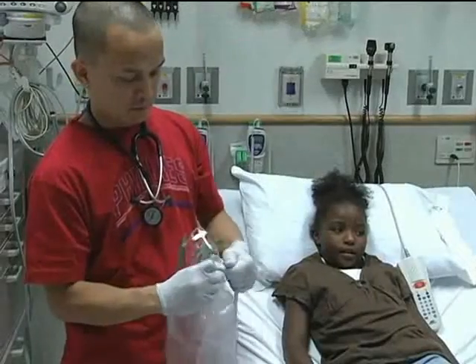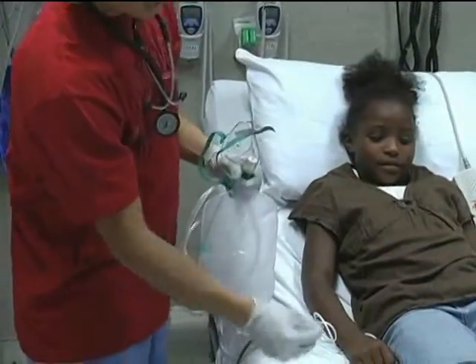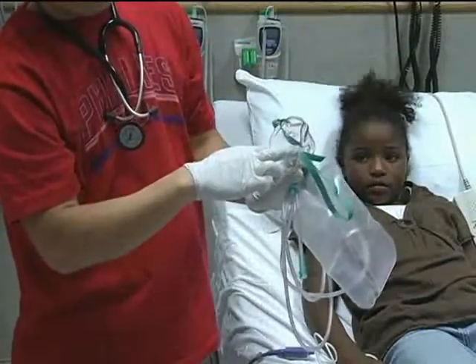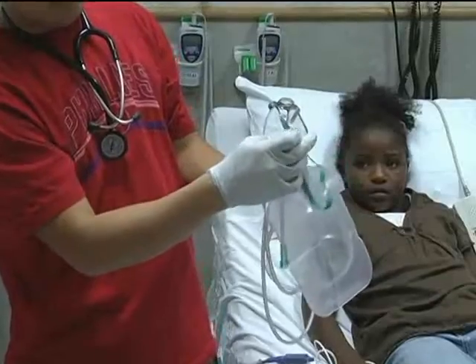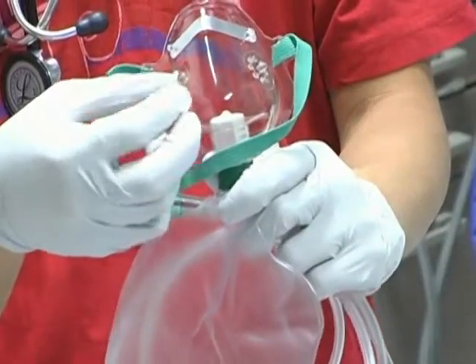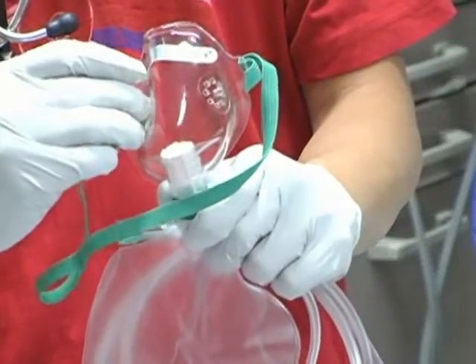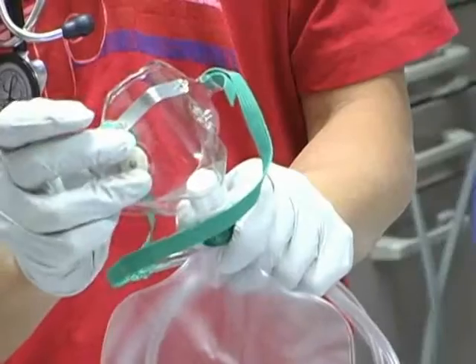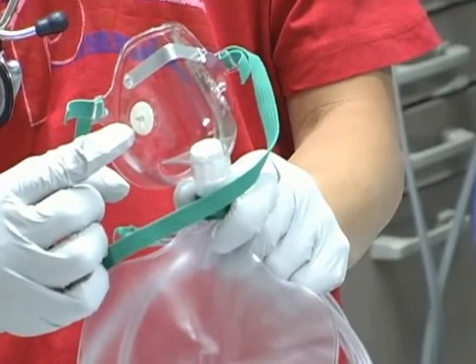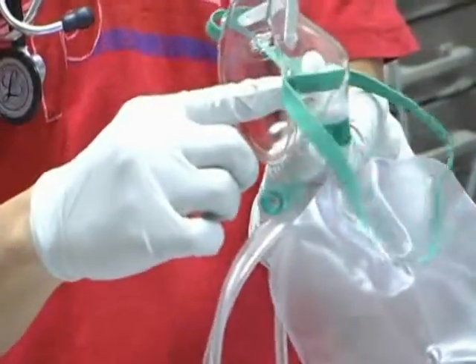To deliver higher oxygen concentrations, a partial non-rebreather can be converted to a full non-rebreather. A full non-rebreathing mask looks much like a partial non-rebreather, but has an extra one-way rubber seal over one exhalation port to prevent entrance of room air and to allow proper exit of exhaled gases. For safety reasons, only one exhalation port should be covered at any time.